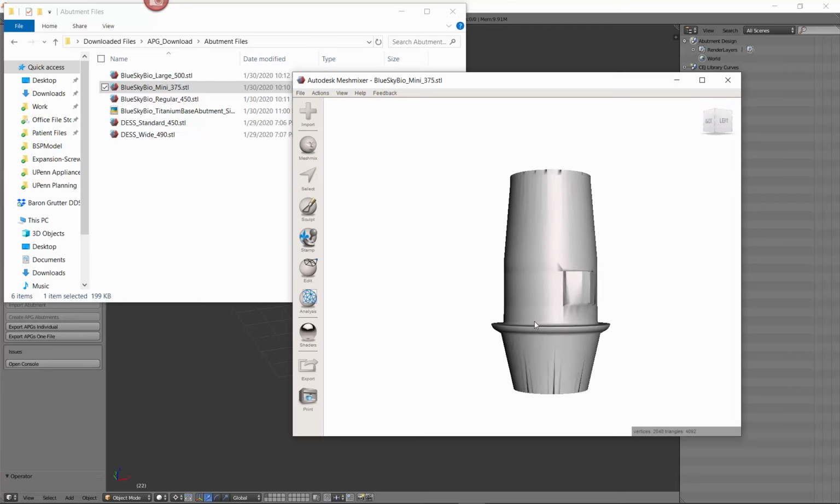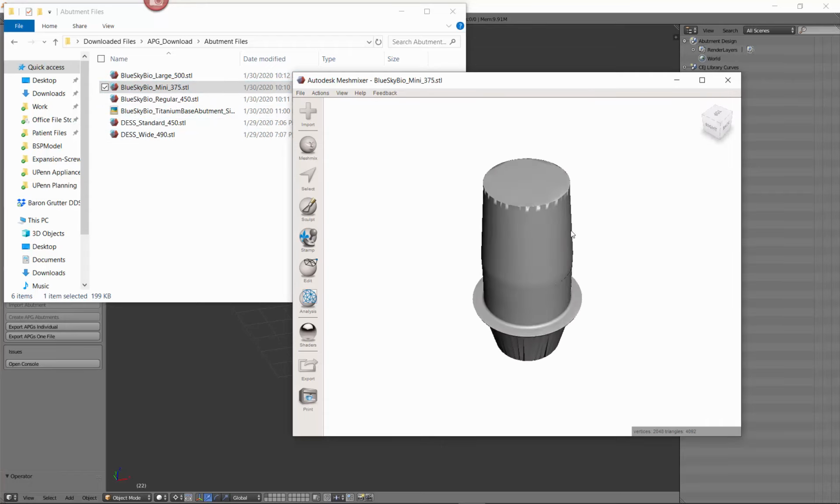All we care about is the chimney, everything above that. So that's why we have a small selection of abutments. This covers so many different things. That said, there are very big different shapes of abutments out there.